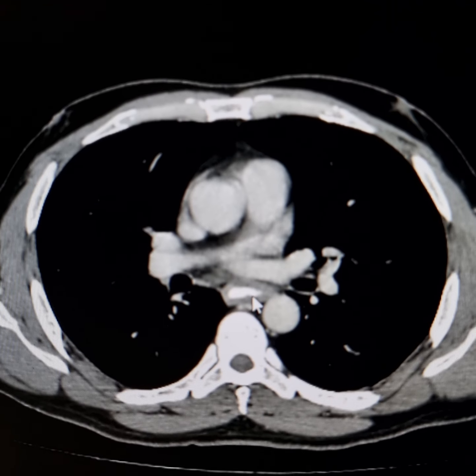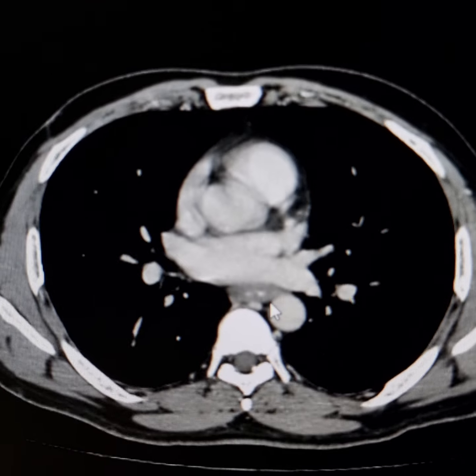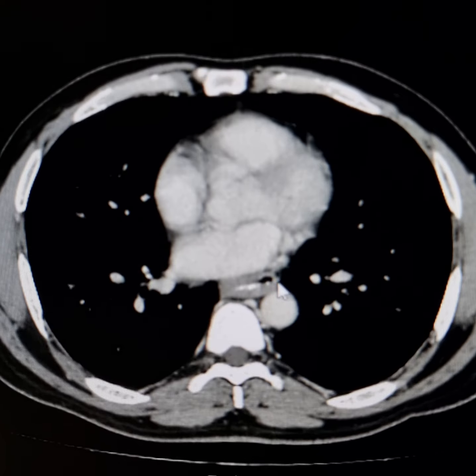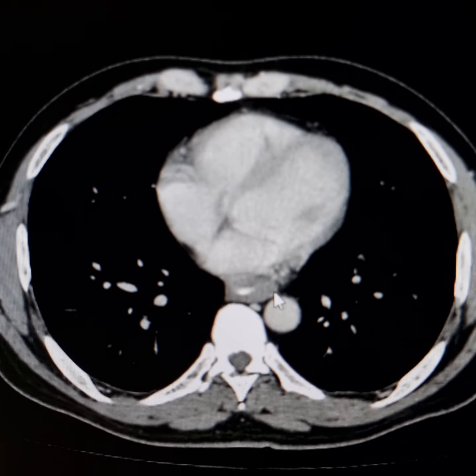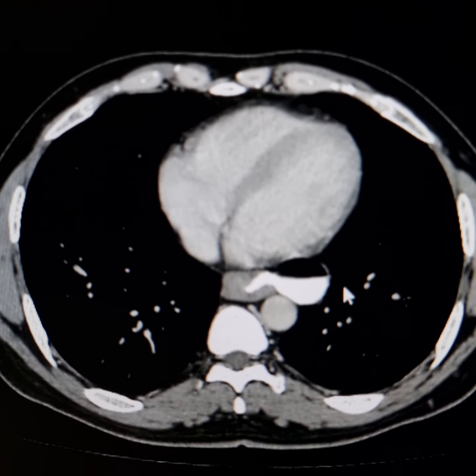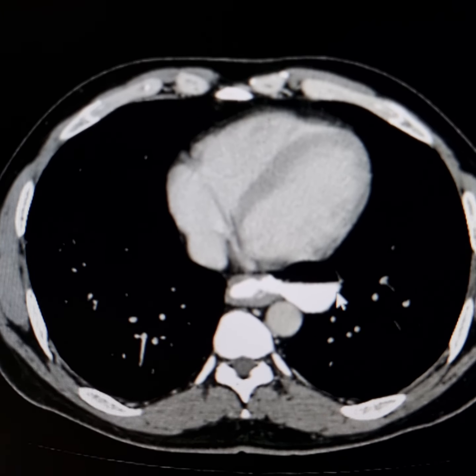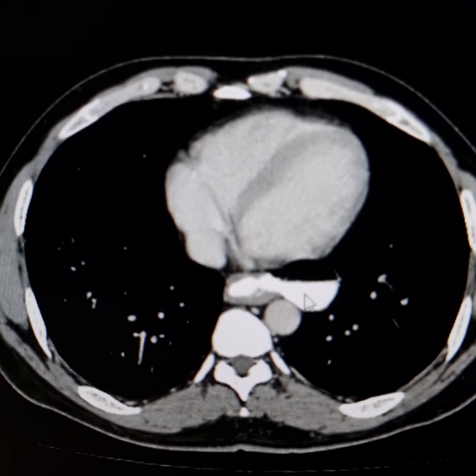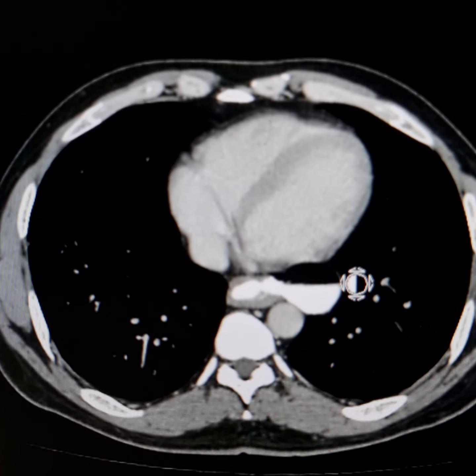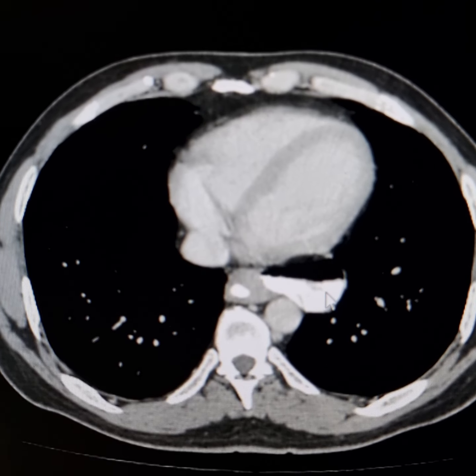Now, please see the circumferential thickening of the wall of the lower end of the esophagus. There's a thin-walled diverticulum which is projecting towards the left side and downwards from the distal end of the esophagus. This is the neck of the diverticulum. This is the diverticulum. There is an air-fluid level of the contrast medium retained inside it.